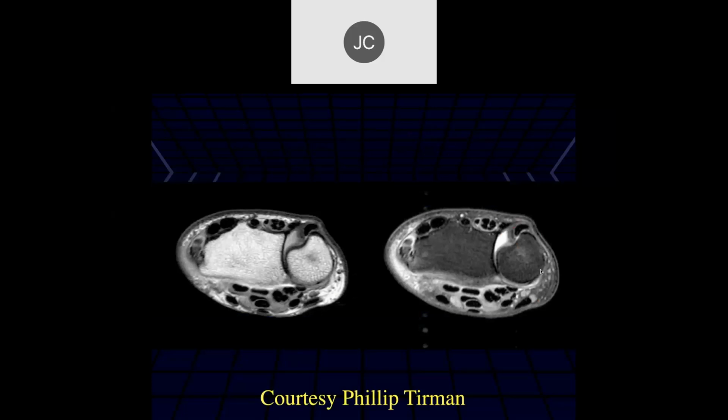Okay. Tayson. All right, so looks like we have tendinosis and mild tenosynovitis of the first extensor compartment. Okay, so we see the two tendons there, abnormal signal, and an abnormal amount of fluid surrounding the tendons.